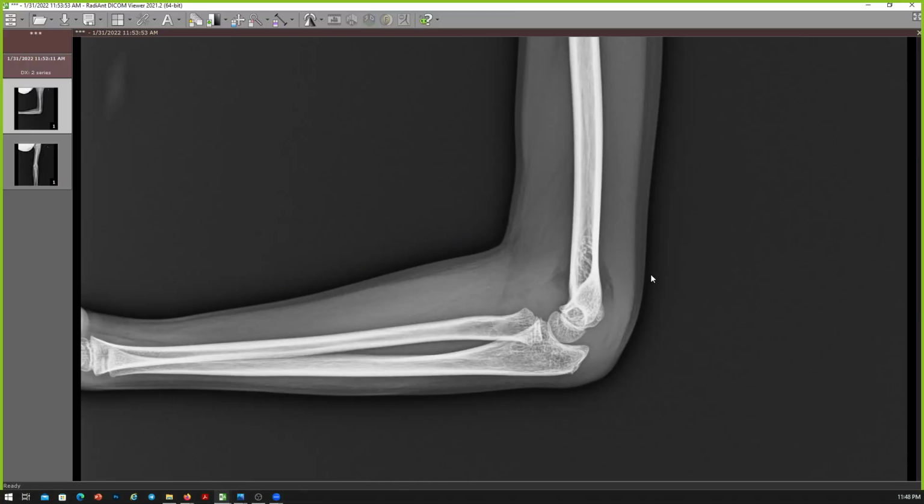This was the first case, again a warm-up kind of case. This is essentially a rapid case. There is elevation of the anterior fat pad and the posterior fat pad of the elbow, which is not usually seen in normal cases, but is seen here. So that signifies that there is some kind of elbow effusion, which will signify that there is some occult fracture. Even if the fracture is not seen, we would treat this as a fracture and inform the referring clinician or the orthopedician urgently. So just for knowledge, just for revision, this has been discussed before.